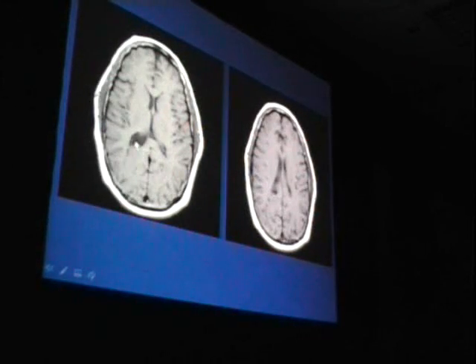And again, these are just the non-contrast images showing this alteration in the structure. Probably easier seen on the T2 weighted images here. This is an FSE image, and again you can see this nodular mass, which is iso-intense to gray, with a small amount of hyperintensity within it, which is actually a small tract from the lateral ventricle. So we have multiple cases with a nodular mass beside the ventricle that doesn't enhance and tracks grey matter on all sequences.